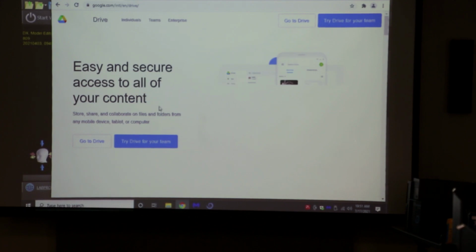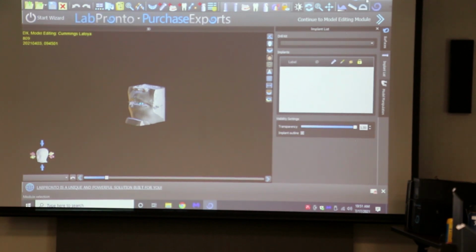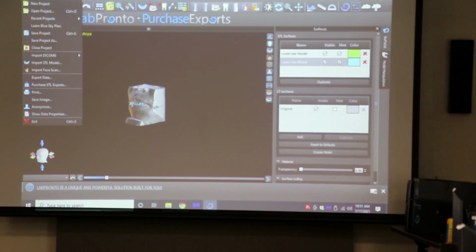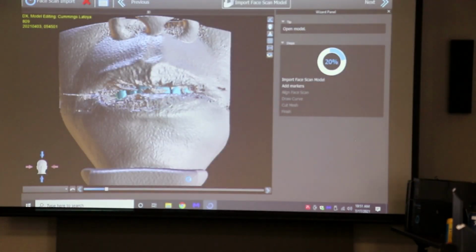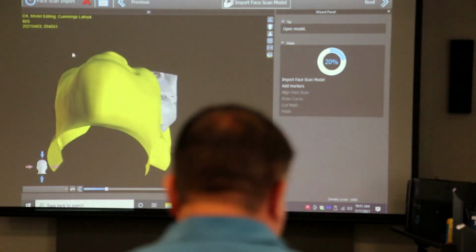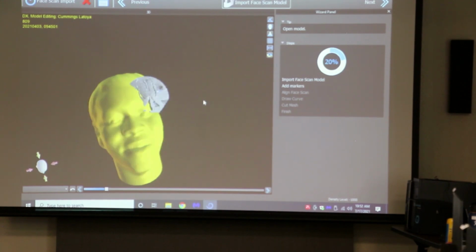So you can't align like this with the color? We can do it in black and white. So let's go through the process. Honestly, I don't think the color really matters in this section. If you just imagine it being in color, when you do it yourself, it will be in color because you're going to be uploading it from your phone. Right now, the most important part is the stitching points. So let's do it in black and white. It's just not going to look as cool, but we'll get the point across. This is normally color because there's another file that I didn't include in there. That's why it's not color. But we can go through the process here anyways.